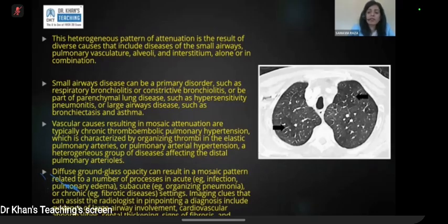That's why I'm saying don't stress too much about what the vessels look like on the CT scan. Just identify that there is mosaic attenuation. Instead of focusing on the small vessels in the lung parenchyma, you can look at the main pulmonary artery. You can look at the main history of the patient, the right heart thickening, the right heart dilatation. Signs like that are more helpful than focusing on the microvascular structure of the lung on CT.